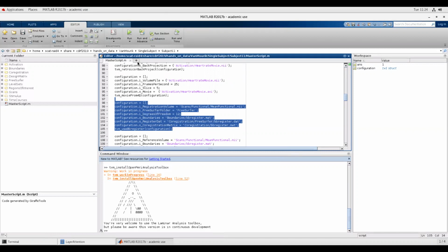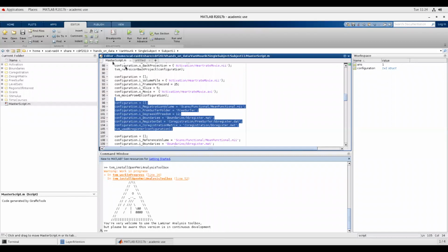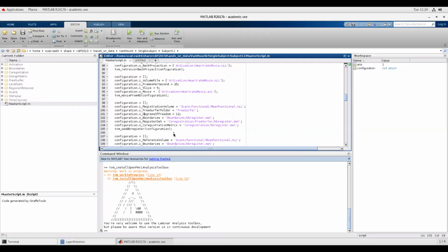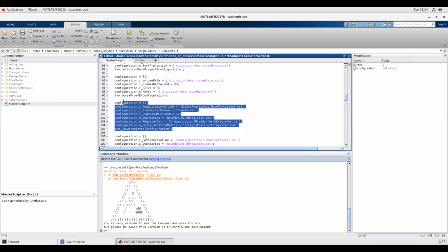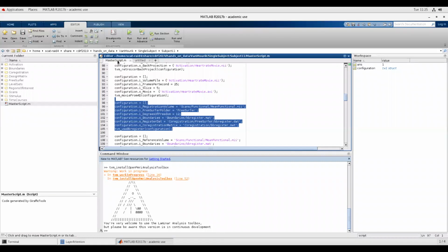So now, how about I just quickly copy that to a new file to be very explicit about what it's doing. Control V. Oh, also my copy and paste hotkeys. All right, now let me quickly Control C and Control V this, and nope, that still doesn't work. Come on.